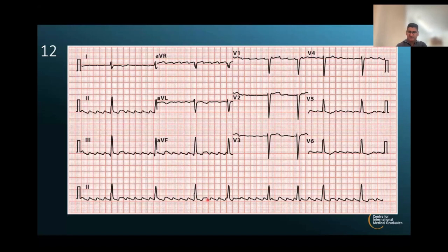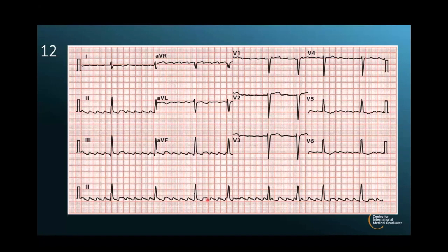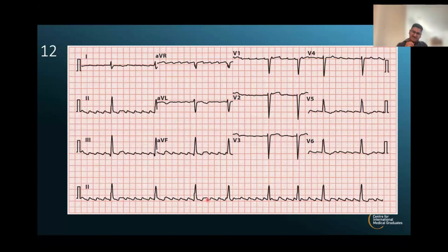is a junction box between the top and bottom of the heart, is not that slick at conducting these very fast atrial depolarizations. So it's selectively letting through sometimes every fourth or fifth beat, sometimes more. It's variable. But you got the nuts and bolts of this. This is someone who's got atrial flutter, which is more on the slower side because of variable block.